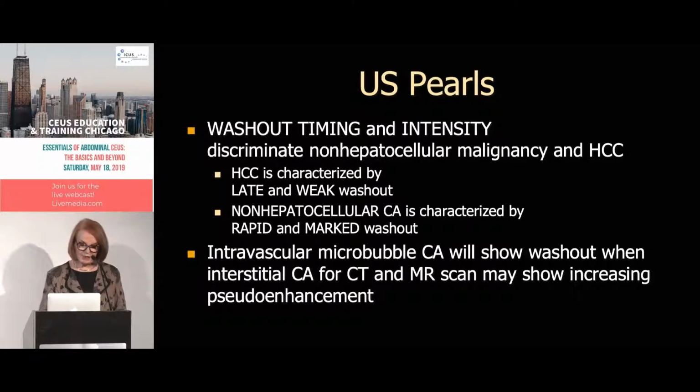And of course, the intravascular microbubble contrast agents will show washout when interstitial contrast agents for CT and MR scan may show instead increasing pseudo-enhancement. And so that's my summation of what I think. If you know all that, you'll do pretty well. Thank you very much.